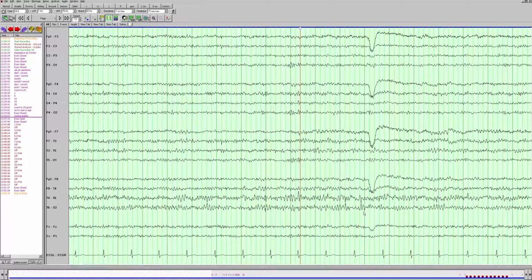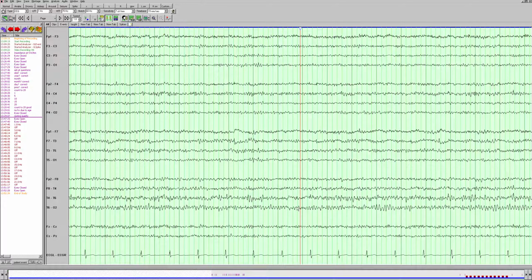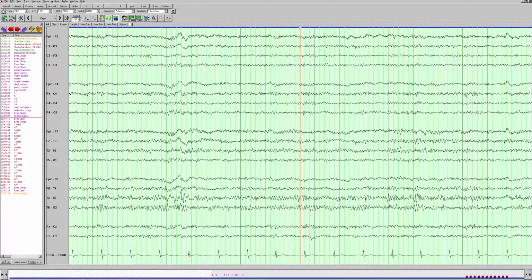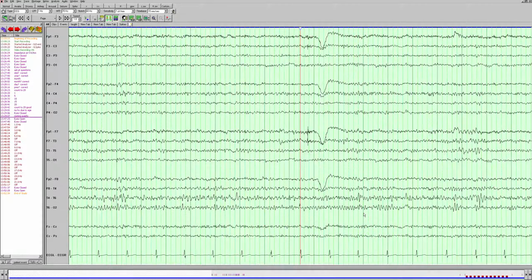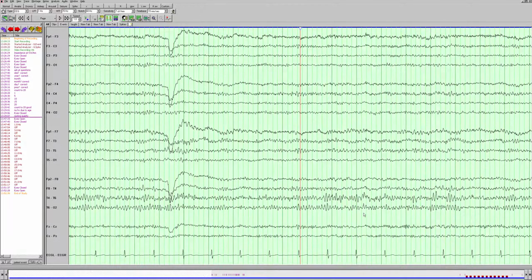So this is just part of the breach. It looks spiky, it looks like it's pointing at each other, but that's not epileptiform. That's just part of the breach rhythm. It doesn't really stand out from the background. If there really were true epileptiform activity here, it would be really high amplitude. It would be really standing out from the background. You'd see a slow wave after it. It wouldn't just oscillate at the same frequency as the rest of the background. All right, as we are going on here, we just continue to see this breach rhythm.